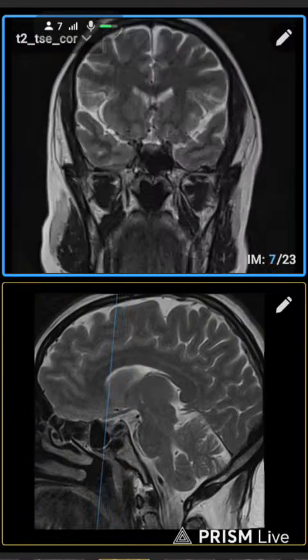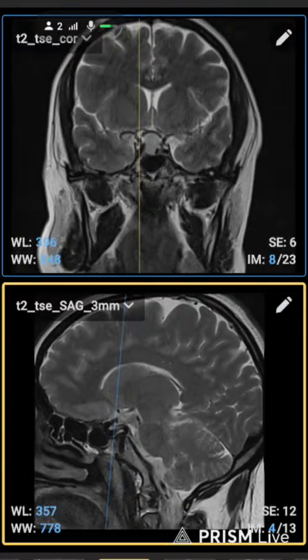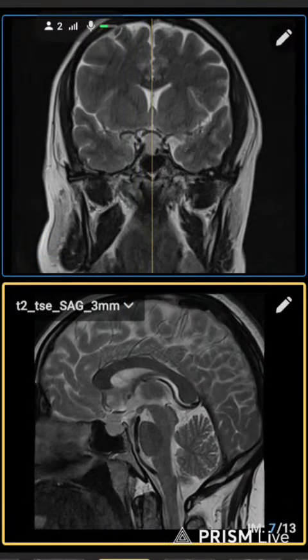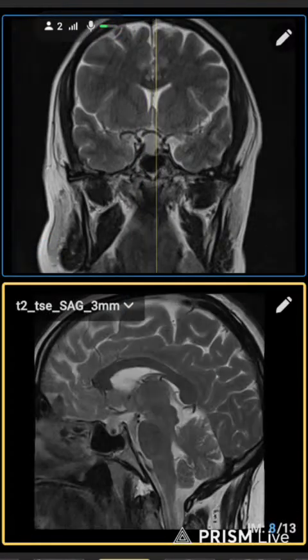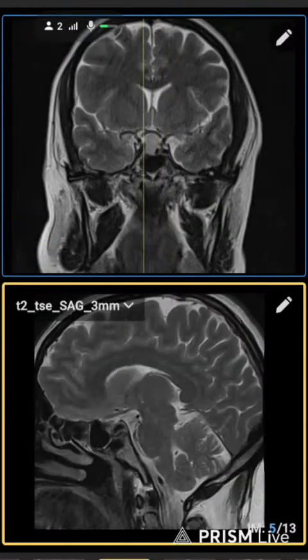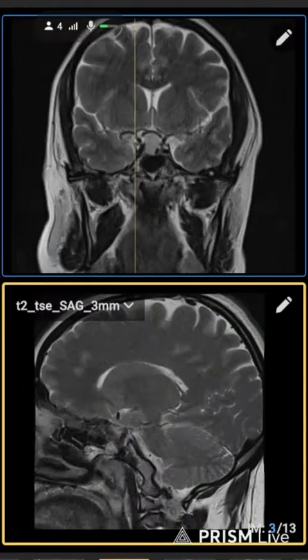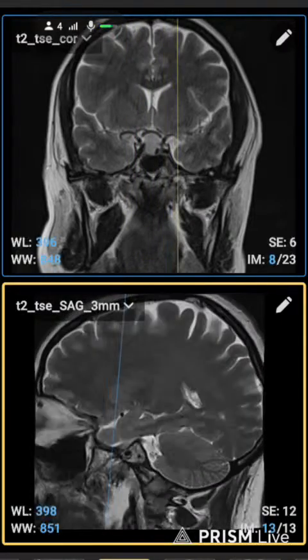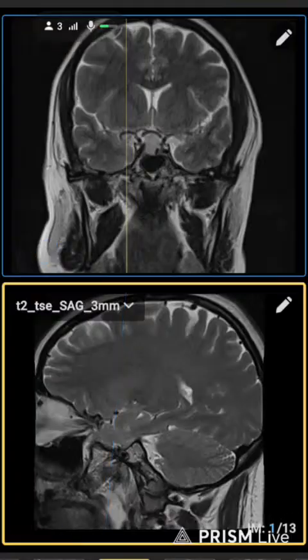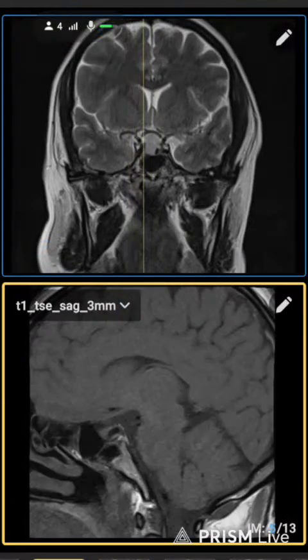I will show you the... Sometimes if there is a large tumor, it will become a larger area. So in this patient, normally in every type of pituitary tumor it includes this much FOV. This was the T2 image and we added T1 image.